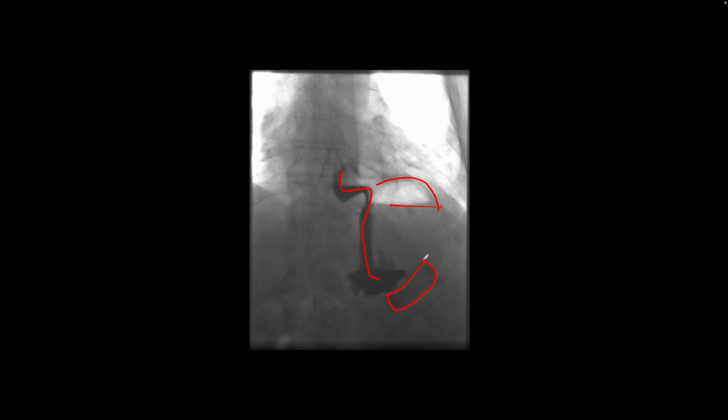Now the gastric lap band is supposed to be up here in this location, and it has slipped and moved more inferiorly. And so this patient has a displaced gastric lap band. When this happens, they don't feel satiety after eating a small meal because the band has displaced, and because of that, they start gaining weight again.